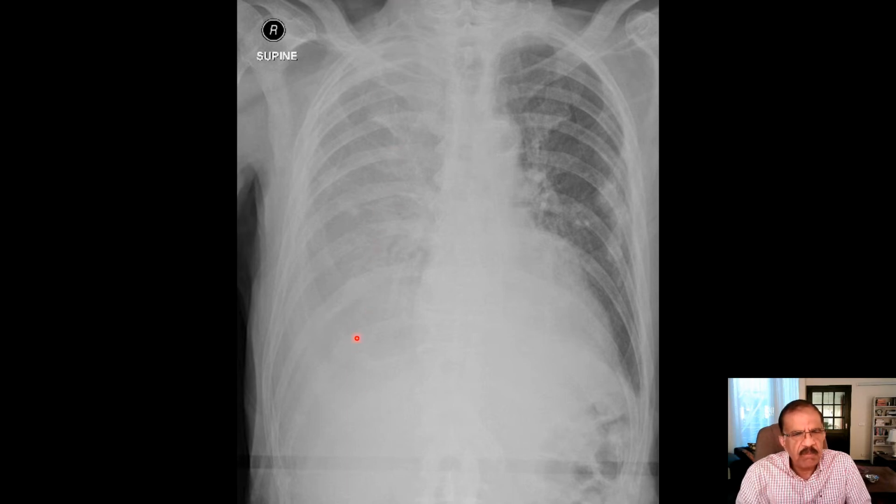It is unlikely to be collapsed, because the midline structures are still in the midline. It is unlikely to be a big tumor because the midline structures are not pushed to the opposite side. It is perhaps pleural effusion, but it is not massive. It is occupying the whole right hemithorax because the patient is supine. So this is another look of pleural effusion.